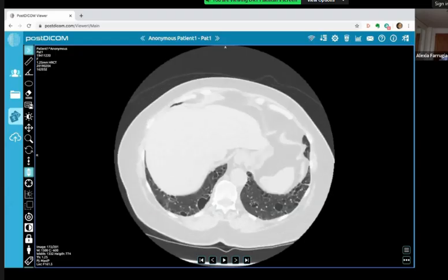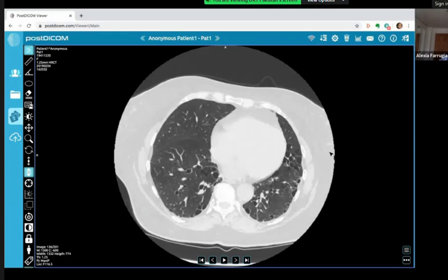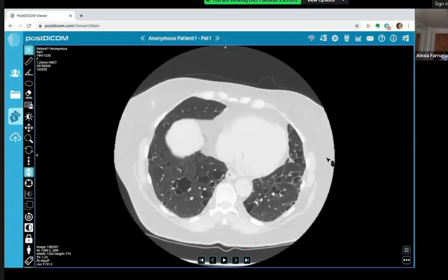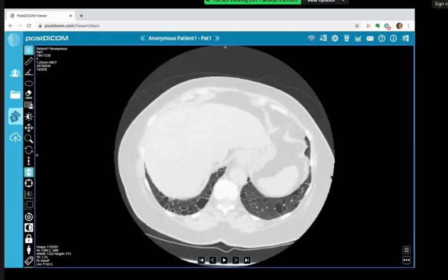Do you feel that the entire lower lobes are involved, or is there any sparing of particular areas? So I think that it's more extensive in the bases, with relative sparing of these superior segments, but there are still some scattered cysts in those superior segments.